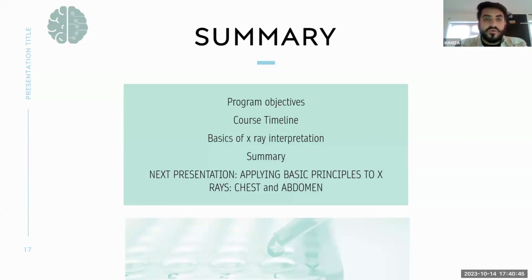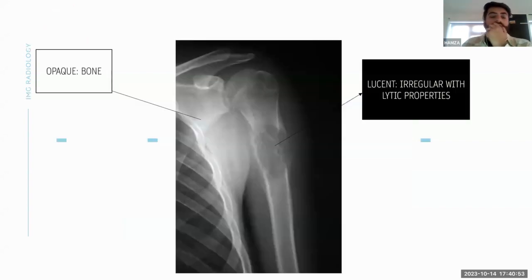When you're looking at X-rays for the arm, as Dr. Karthik just showed, could you go back to the previous slide if that's okay? Yeah, as Dr. Karthik just showed, if you saw something like this in the ward or even the emergency department, the first thing after identifying the patient's details is to talk about what you can see. In this particular lesion, what Dr. Karthik described as a lytic lesion, you can see that there's some lucency in there, and it's an abnormal amount of lucency. You shouldn't really be seeing that much lucency, even translucency, within something as hard as bone.